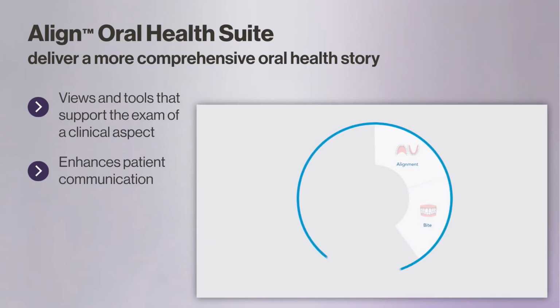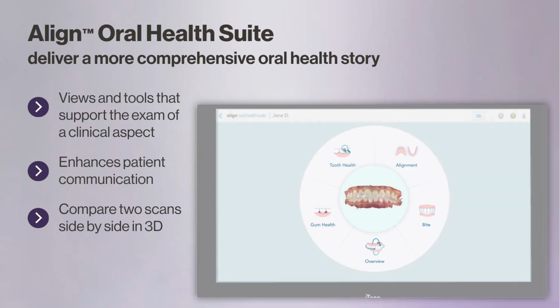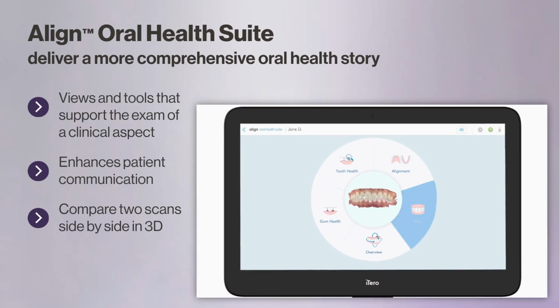Further, with a regular scan history, the 3D side-by-side comparison of the clinical conditions over time is possible. What does each view offer?